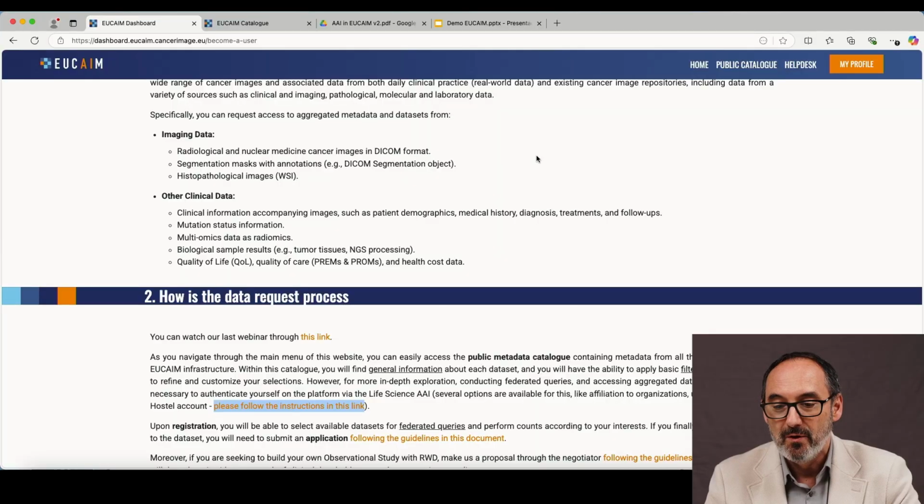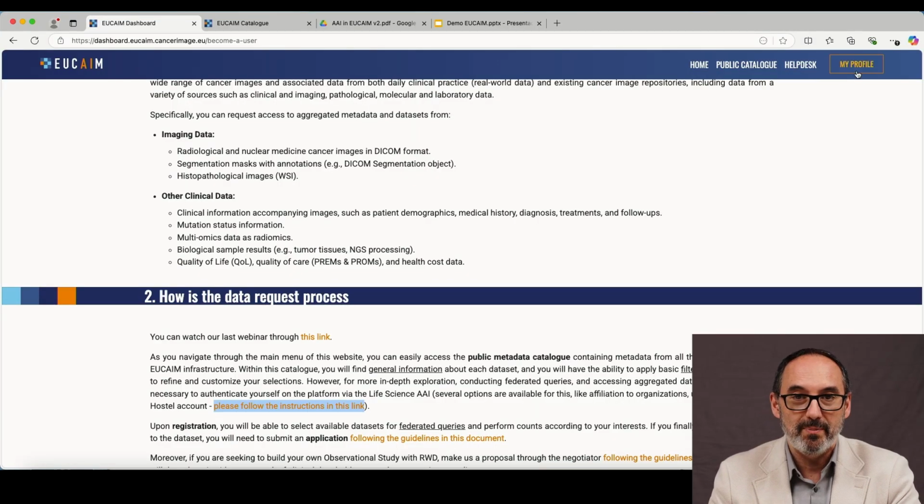It means that in my case, as a university professor, I will use the same credentials as I use at my university. For this purpose, you go to my profile and you go to the registration, but I already have an account prepared for that.